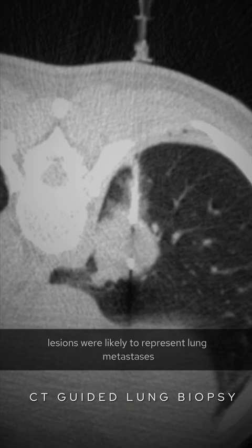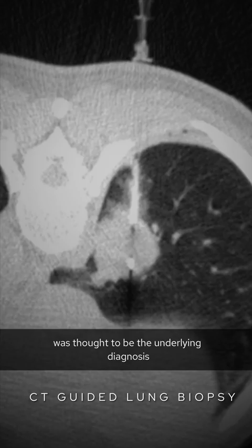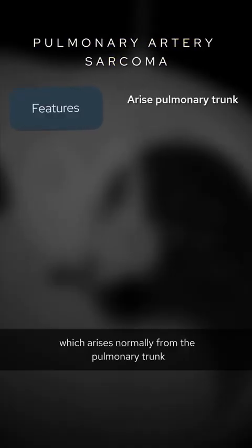Either way, the lung lesions were likely to represent lung metastases, and the patient went on to have a lung biopsy, with the results suggesting an underlying sarcoma, meaning a pulmonary artery sarcoma was thought to be the underlying diagnosis. This is a relatively rare tumour, which arises normally from the pulmonary trunk. It mimics PE, and the diagnosis is not usually made initially, and only when the patient re-presents with symptoms and the pulmonary artery filling defects persist.